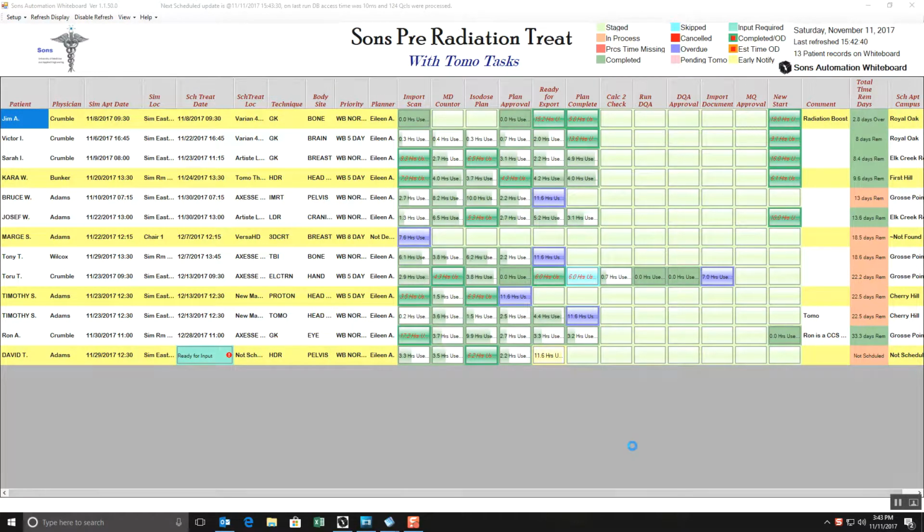During this demo, I will try to outline the functionality of the Sons Whiteboard and what makes this application different from other EMR whiteboards. My name is Mark and I have Gina here with me. Gina and I will walk you through the Sons Whiteboard.